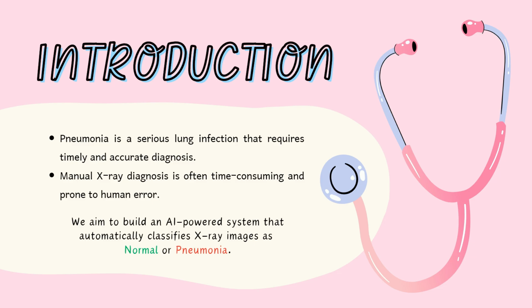For this project, I used a publicly available dataset from Kaggle provided by the National Institute of Health. It contains over 30,000 chest X-ray images divided into normal and pneumonia categories. This is real medical data, and our goal is to train an AI model that can learn the difference and eventually help save lives.